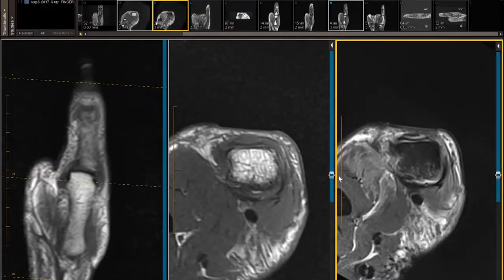As an aside, there are 4 dorsal interossei and 3 palmar interossei, although the interosseous next to the thumb is not really an interosseous. It is formed by the adductor pollicis. That's why there's only 3 along the palmar side and 4 along the dorsal side. That is an example of a Stener lesion with all the signs wrapped in a neat package.